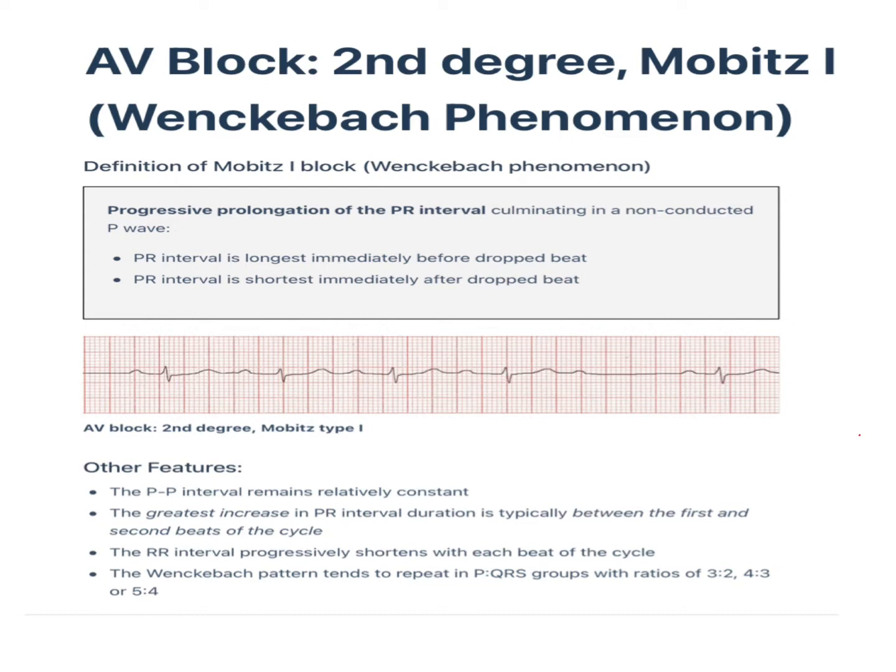Coming to the second degree heart block, it is also called Mobitz type 1 or Wenckebach's phenomenon.